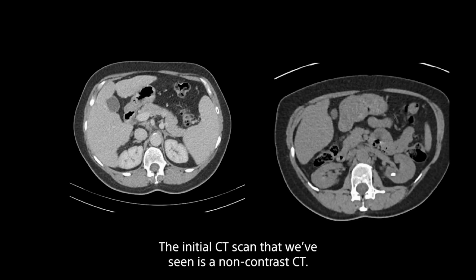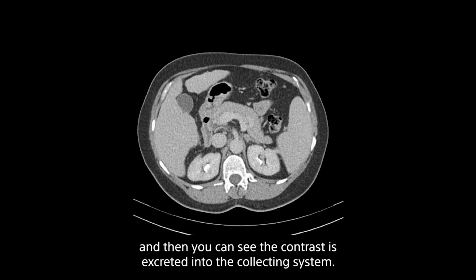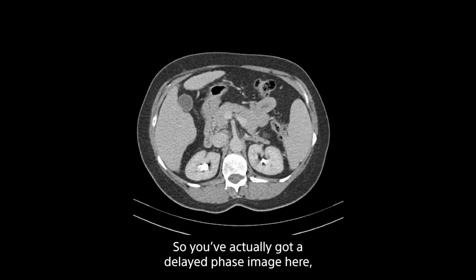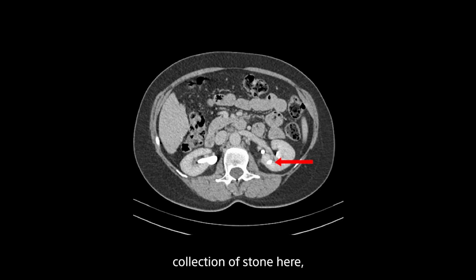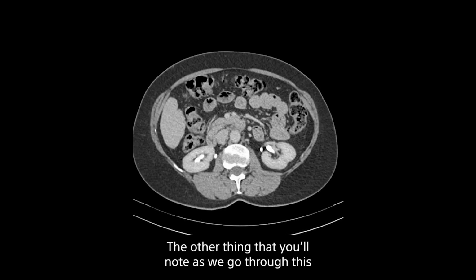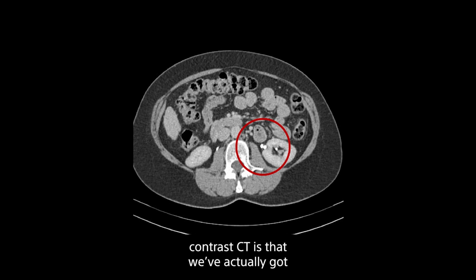imaging. The initial CT scan that we've seen is a non-contrast CT. But in this CT scan here, you can see we've got some contrast, and then you can see the contrast is excreted into the collecting system. So you've actually got a delayed phase image here. And then as we go through this, you've got this collection of stone here, or you can see there's a cavity there essentially, and that cavity is a calyceal diverticulum, which has got the stones in.